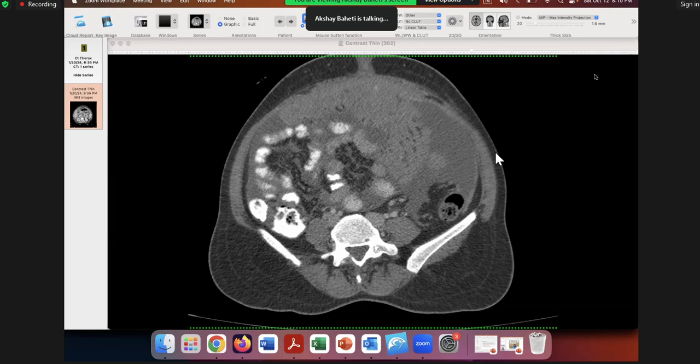Can the post-therapy status have calcific mets? Yes, they can. In fact, calcification can develop post-therapy, but that diffuse calcification that I showed you is always low-grade serous. That diffuse amount of calcification will not happen post-therapy. It will be some focal punctate dystrophic calcifications. Okay, so that sort of answers the next question also. How do you differentiate ossification from calcification? Calcification is extremely dense, HU-wise, right? Ossification is cortex plus medulla. So in the case I showed you, there was a peripheral cortex and a central medulla. So that way you can differentiate.